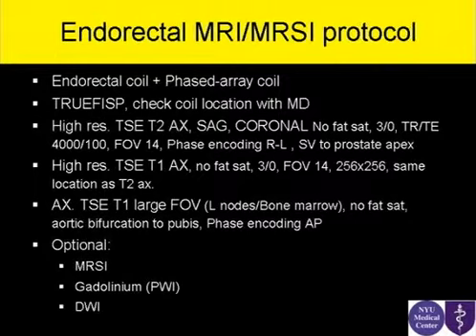And then after that, we perform a high-resolution T1 to match exactly the axial T2 to look for hemorrhage. That's the main indication for T1, really looking for hemorrhage and eventually looking for some bone mets, but it's a small field of view.